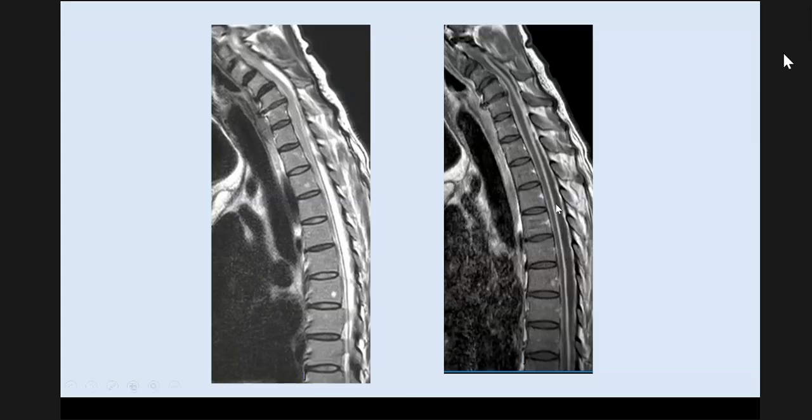Okay, and then the patient had a post-contrast scan, and you can see the collection here very nicely because the collection is now demarcated by quite avid enhancement of the dura. Okay, so there is enhancement of the margins of the collection. You can see the enhancement of the collection. Okay, so there is infection. The patient has a very high white cell count and CRP, and so the question is where is the collection coming from?